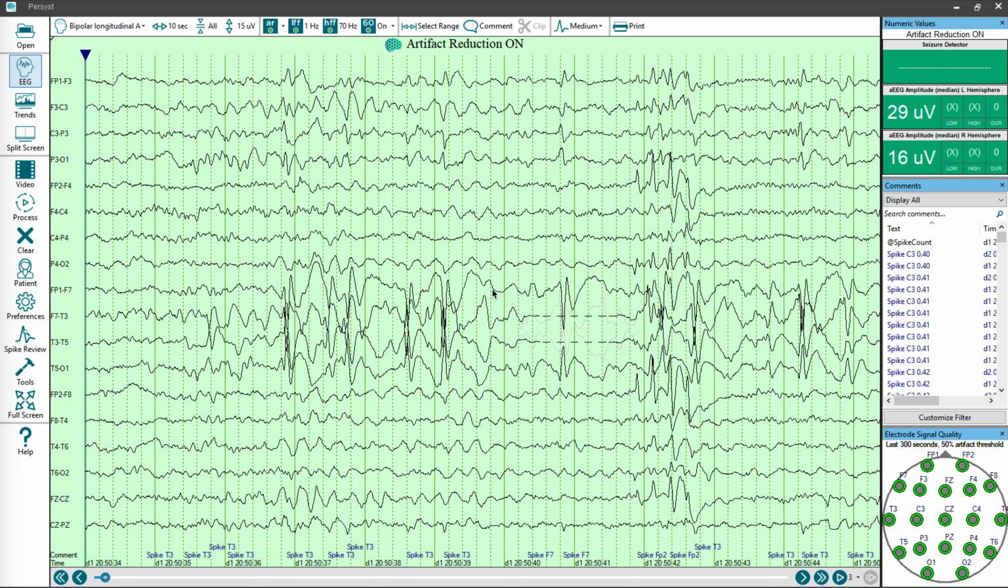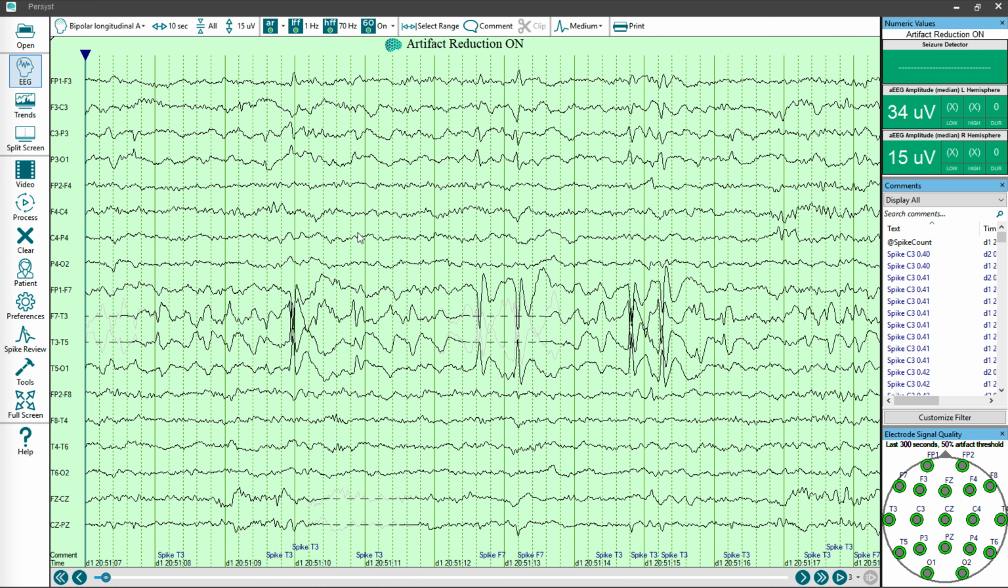Hello, this is an ad hoc screencast. Just going to look at the use of scaling on the FFT spectrogram, selection of units.